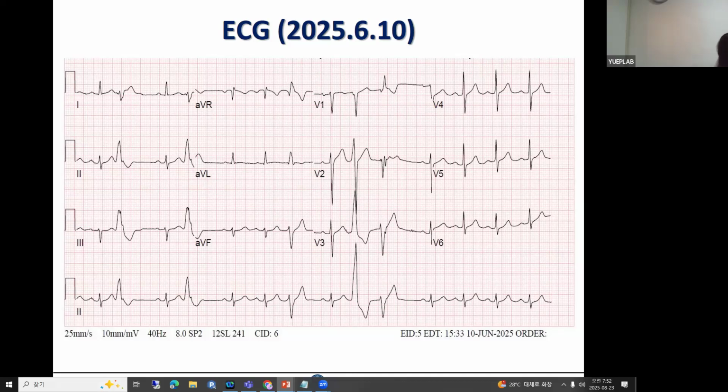But I don't see your laser pointer. Yeah, please. Better, at the bottom. That one. Okay, good. This one, and this one. Can you follow the mouse? Yeah, this and this and this are going to be PVCs, but I think this could be an aberrant conduction from the premature complex.